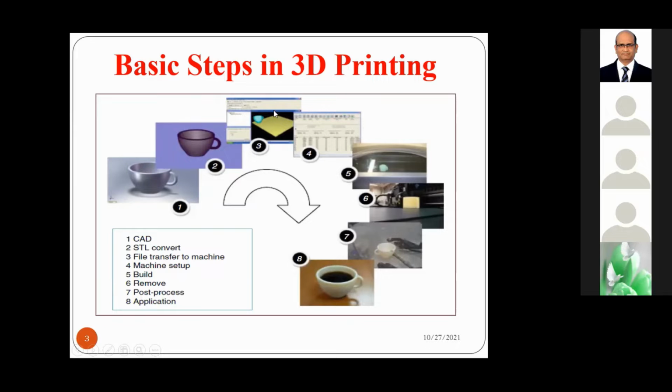Then we add all the information, the material information and whatever parameters are required, and set up the 3D printing software. Then that file is sent to the machine. Up to here we require software. Today I'm giving a demo on how to develop an STL file with various techniques: the CAD model technique, the CT/MRI technique, and 3D digitization systems. That is what we are going to learn.